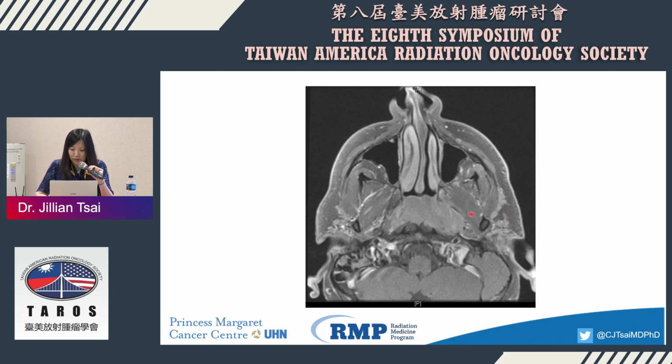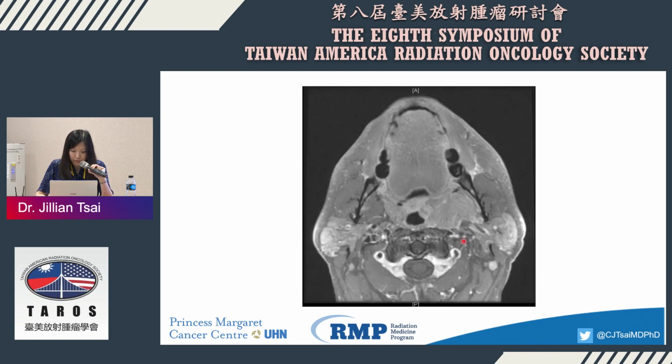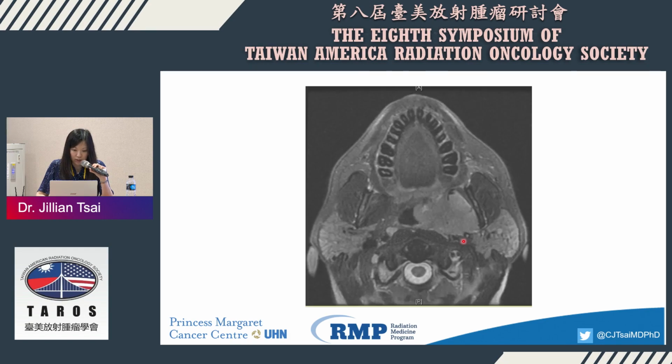And then with the left Fossa of Rosenmüller obstruction, and onto the right, to the midline, the right Fossa of Rosenmüller, and then parapharyngeal fat. And then you can see that right here, probably invasion to the left palate as well. So this is a very, very advanced stage.